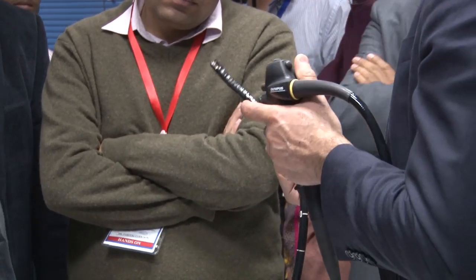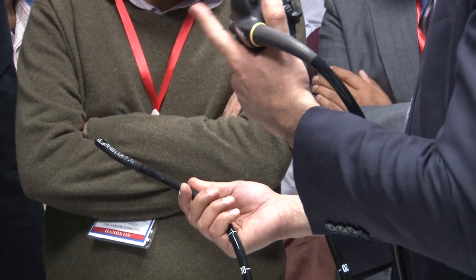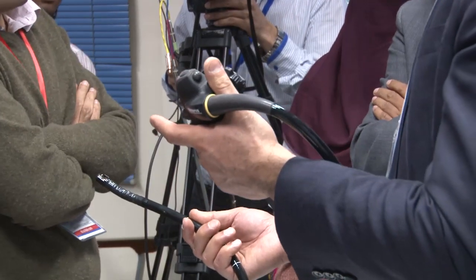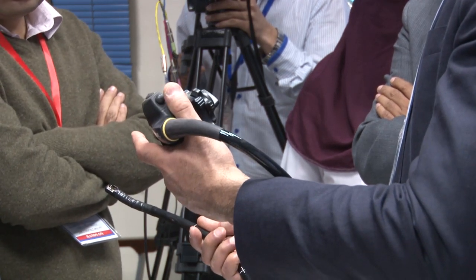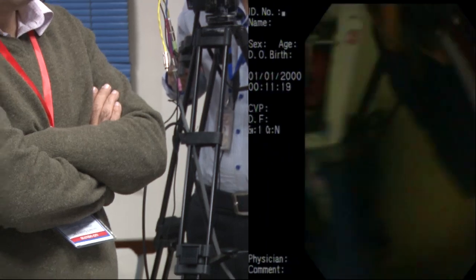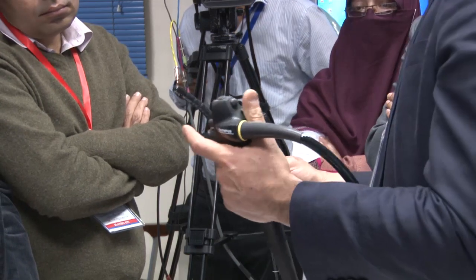And then more importantly, there is the bridge. Whenever we talk about bridge up, it means moving the cannula or the accessory up. Bridge down means moving the cannula or accessory down, right? The actual movement on the bridge is exactly the opposite. Bridge up means bringing the bridge down, right? And bridge down means up, right? So you go by what you actually see on the accessory. Bridge up, bridge down, okay? So that's how you start off.